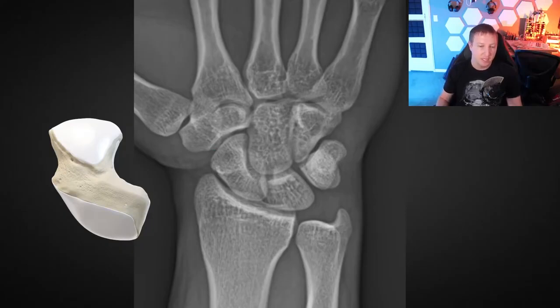And so looking at the scaphoid here, it has a bit of anterior tilt to it. So we actually don't see the scaphoid laid out nicely on our standard wrist series because it is oriented a bit anteriorly on the distal side. It's a bit tipped forward here.